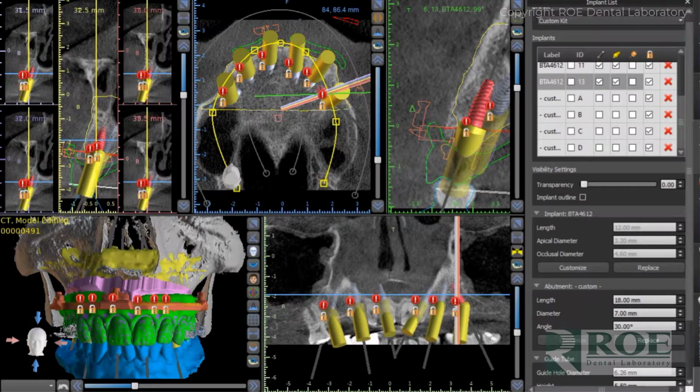The proposal for tooth position, the bite, the opening, the case is really set up for hopefully a 30-minute meeting to go through each implant site, manipulate the implant, put it in just the right position, and generally those meetings, almost always those meetings go one time and then we go forward with the case. Sometimes there is some changes perhaps in the teeth, the tooth position, that type of thing, or perhaps a change in bone reduction leveling where we may have to go back and do a new setup and have a subsequent online meeting. But for the most part, it's one meeting and then we move on.